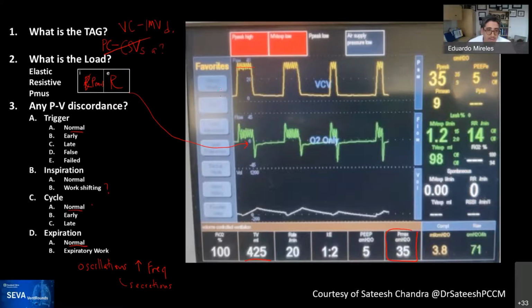Do you disagree with that, Rob? I can't say. That's just so bizarre that there's no way to interpret what's going on. Well, that's what I can see, because this is not volume control. Would you agree? Yeah, it's no control. That thing is out of whack, completely out of whack.